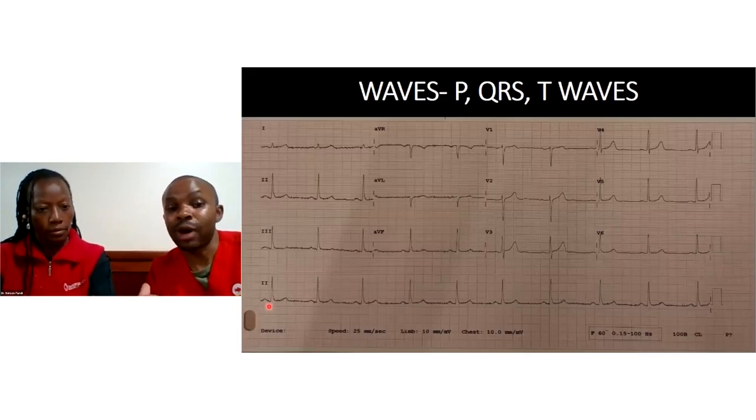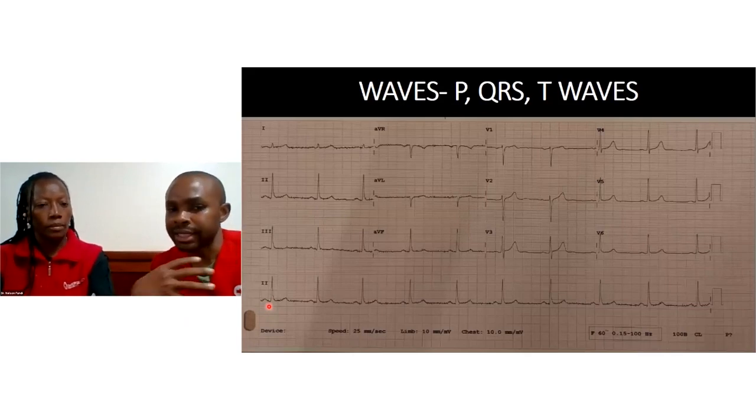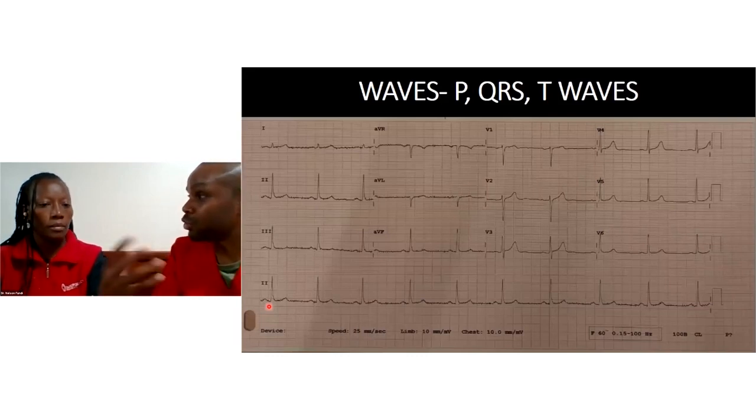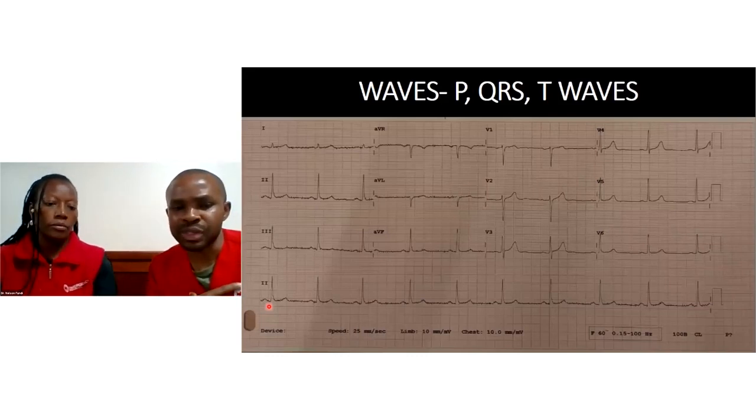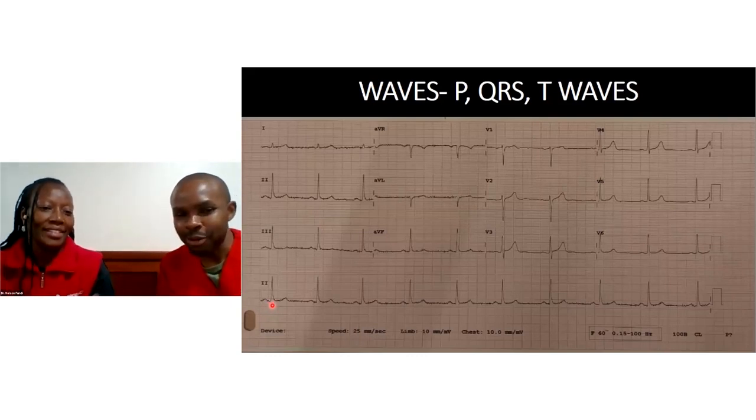If it's longer than that, I'm wondering, could this patient be having blocks? So either first degree, second degree, third degree, and I'm wondering, could this be contributing towards my patient's symptoms? All right, good. After the PR interval, what next, Grace?